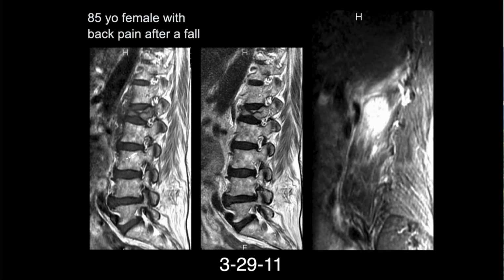So this is 32911. This just shows that we have some edema going into the soft tissues. You always want to evaluate the soft tissues. If it's tumor, you'll often get tumor infiltrate around. When you have an acute fracture, you can get hemorrhage around it, which can also, if you're not careful, masquerade as a tumor. So you have to be careful. But again, here we can see the cortical margins are nicely intact. So this was just osteoporotic.